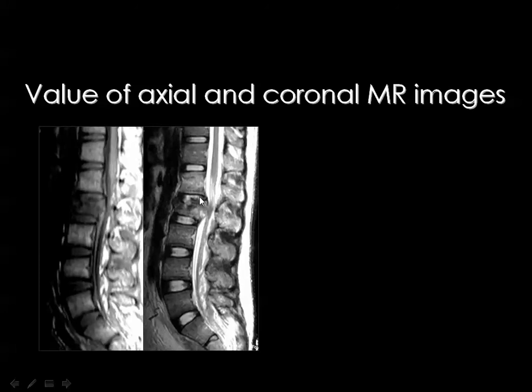And here is a fracture at the level of this is L5, L4, L3, and L2. The fracture is in the form of compression with some comminution of the vertebral body, depression of the superior end plate, posterior subluxation or retropulsed bone fragment encroaching on the spinal canal.